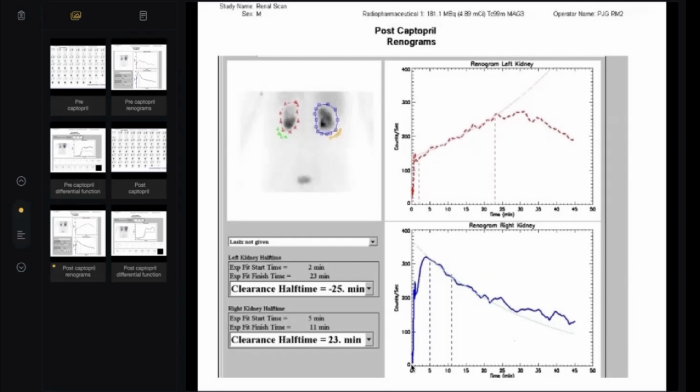What happened? Normally, I will explain from the scratch again. If you understand the renogram, I think more than 70% of nuclear is smashed. Okay? See what happened in the beginning. In the beginning, there is uptake. Then, by the way, there are many phases, many names like perfusion, time to uptake, time to excrete, many. This is not important.